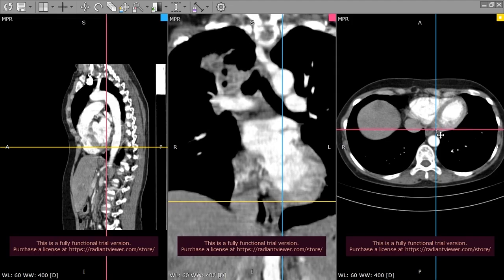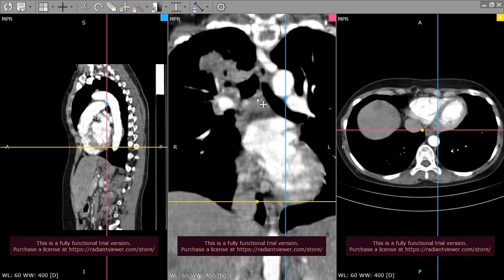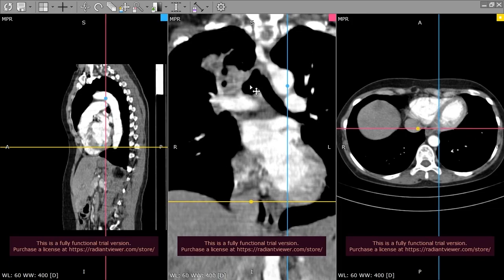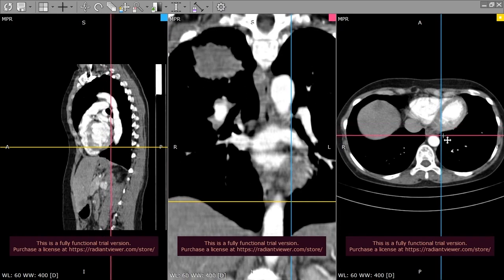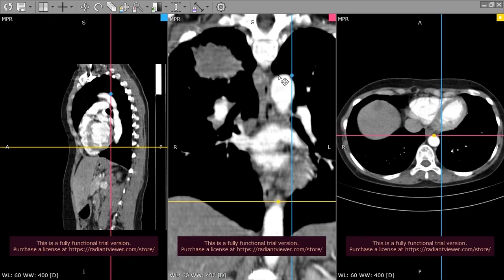One of the reporting criteria here is to measure the distance between the most proximal part of the lesion and the carina. It is actually reaching the carina, so there is no distance between such lesion and the carina itself. After you diagnose such a lesion, you notice its shape, its bronchial attenuation, its distance from the carina. You can measure it in 3D dimensions.